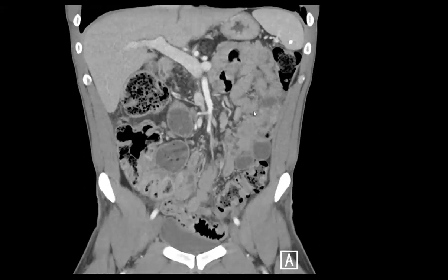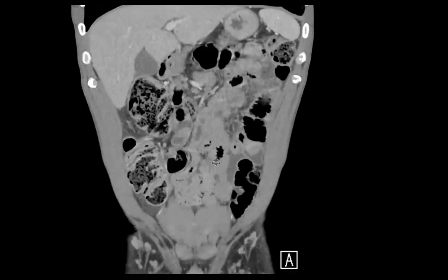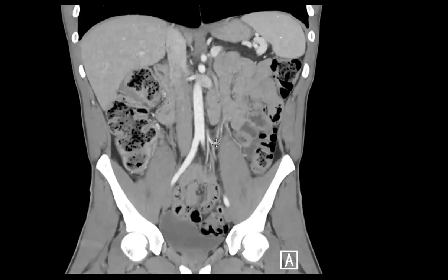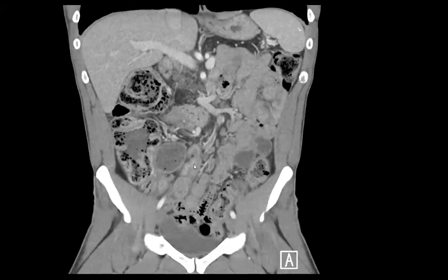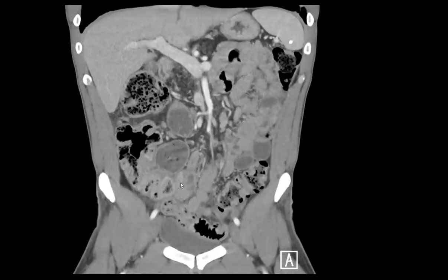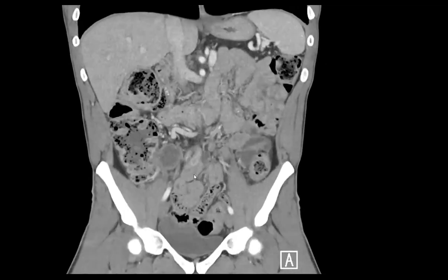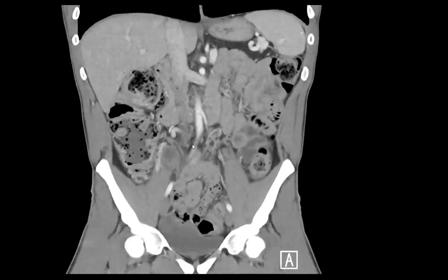I was looking for steatorrhea. Sometimes we see fat-fluid levels in the bowel, but we didn't see that. That's a common thing we see when they stop their pancreatic enzymes because they can't digest the fat anymore. And this is not a surgical small bowel obstruction. No. His appendix was actually dilated when he presented a few months back, and they called it appendicitis, but it had hyperdense content.